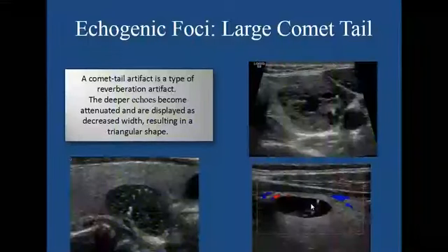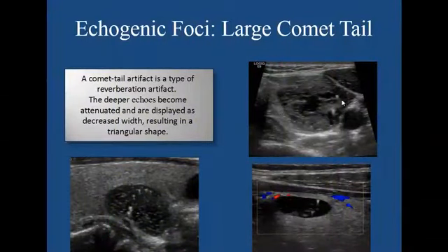So the last category that we have is the echogenic foci, and as I mentioned, in this category you can add more than 1 point. Either we have a large comet-tail artifact like this and this, and by large we mean calcification with a large comet-tail artifact greater than 1 millimeter.